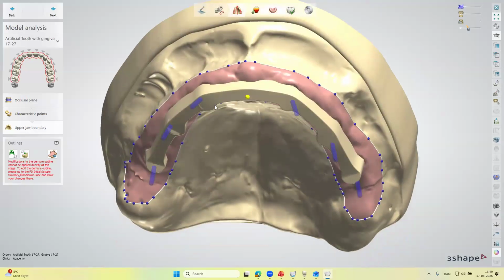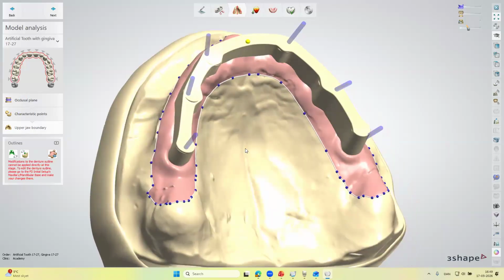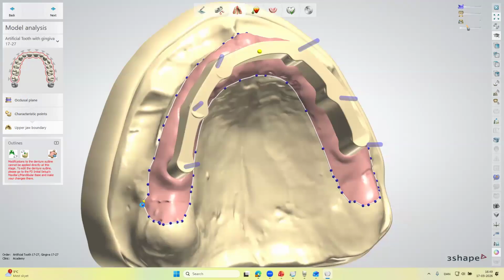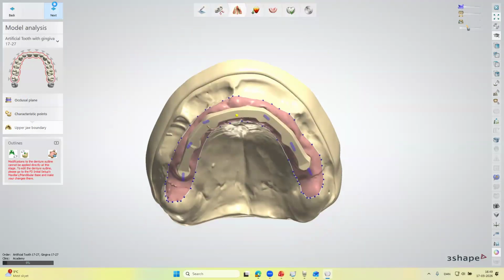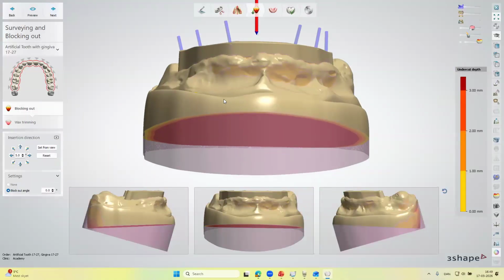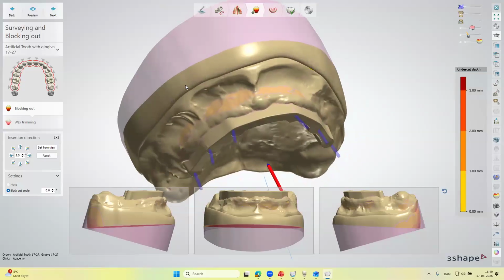It might be a bit distressing that the bar in here is not coming with the same color, but that's not something that I would worry about just yet. And what you will usually notice is that creating the gingiva might give a little bit different results if the model is not watertight.